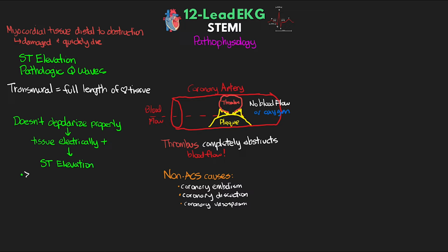If we see this ST elevation greater than 1 millimeter, so one small box, in any leads except for V2 and V3, and in 2 or more contiguous leads, then this is our criteria for STEMI.